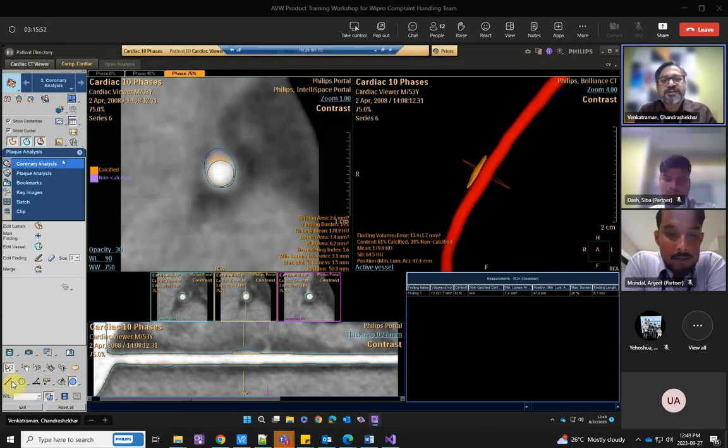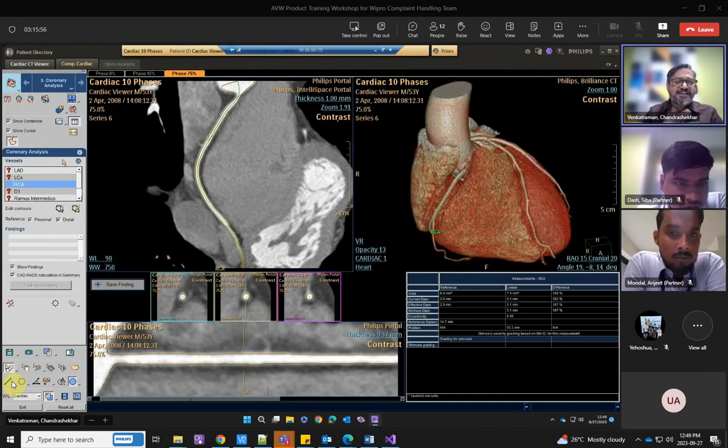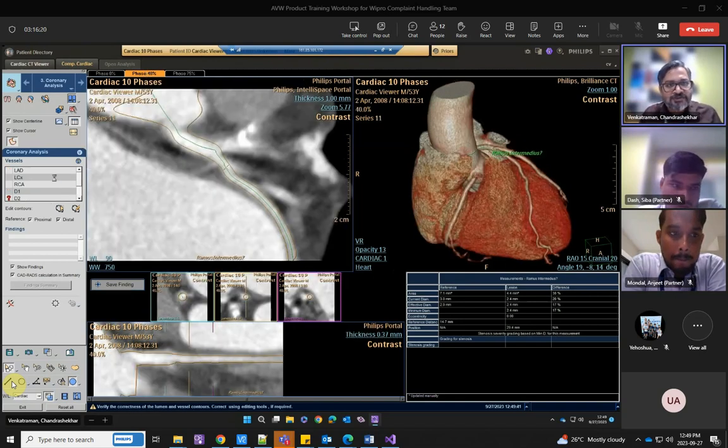So let's go now to coronary analysis. Stenosis analysis is critically important, something the doctors have to do, because this is where the lumens are narrowing down in the vessel. Those points are called stenosis. Let me show you one particular vessel over here. Load.